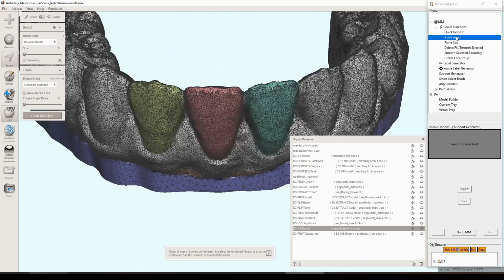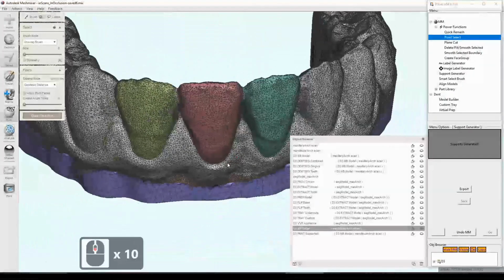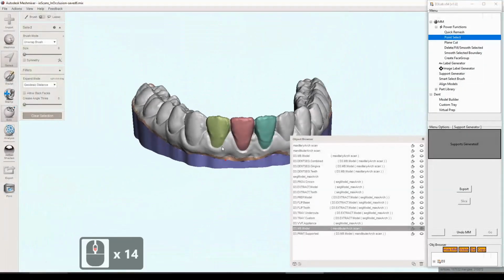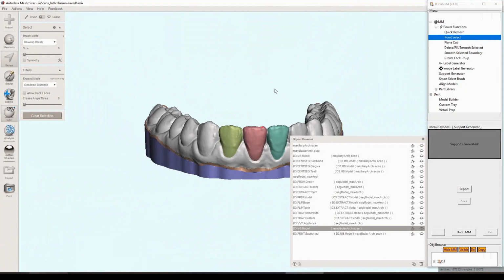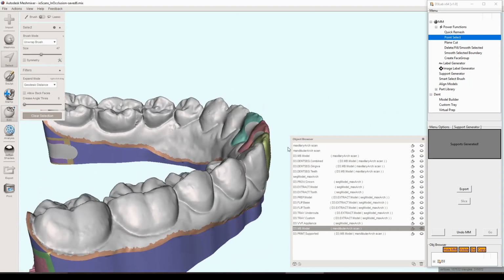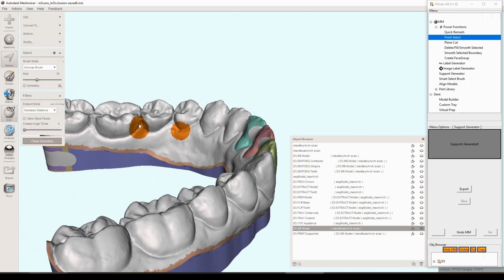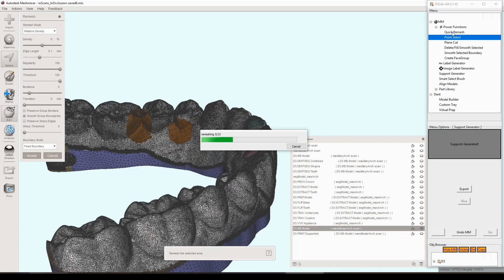The next thing up is something called the point select. It's been in there since the very beginning in D3 Mesh. Essentially, all it does is zoom in on the model and enable something called wireframe, which shows all the individual triangles. It really comes in handy when you're doing some fine detail work on the mesh, some repairs, things like that. Probably the average person won't use it that often, but it's nice to have it for those that need it.